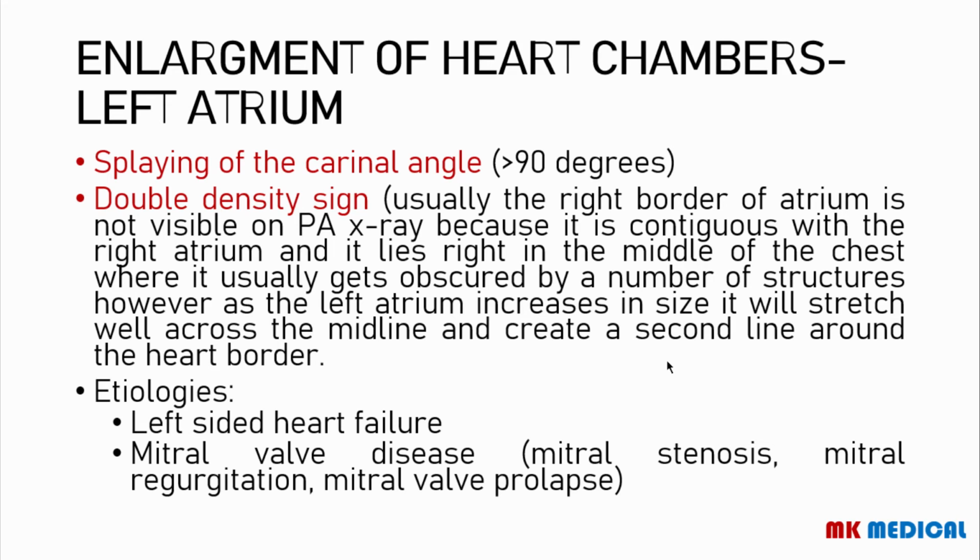Remember that on the posterior anterior chest X-ray, the left atrium is not normally visible as a border. The reason is that it lies right in the middle of the chest, and so it's obscured by many structures.